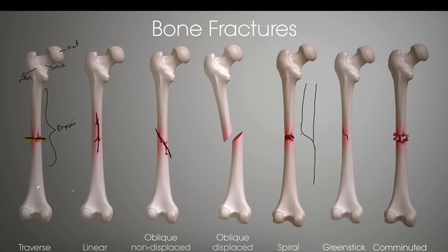In the diaphysis, that fracture will be like this, okay. That means it's a spiral part, it's twisted, because this spiral fracture happens because of twisting injuries, okay. If any person has any twisting type of injury, we can see that it is a spiral fracture, okay.